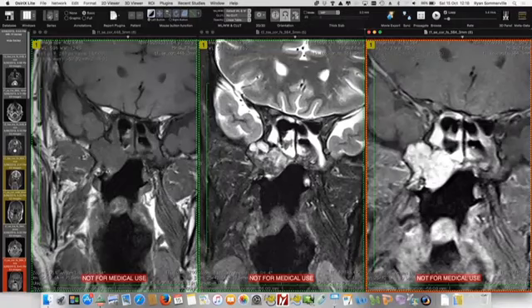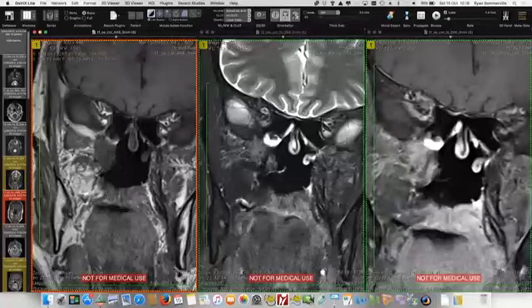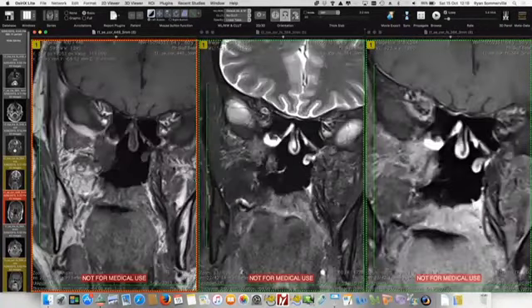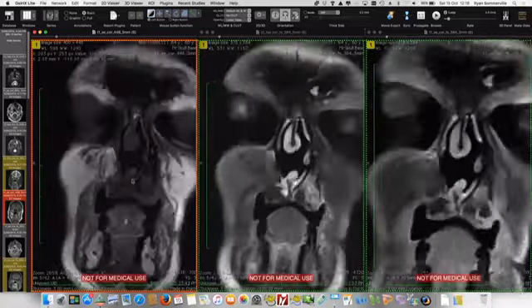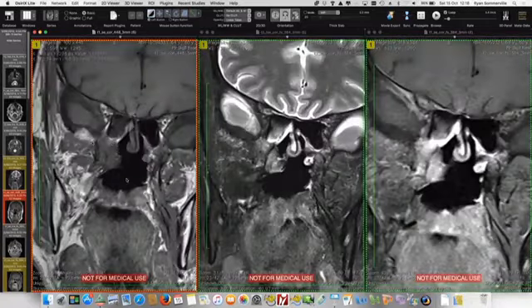So I just want to show you the previous surgery. You can see as we come forward, there's the denervation change of the pterygoids and the infratemporal fossa, and the flap coming through here. So you're going to expect, this is a very abnormal nasal cavity, which we'll see in a moment. He's got no septum left, he's got really nothing left there, and it's going to be scar as we approach the back end of that, and then immediately go back into where that tumour sits, coming off the front end of the sphenoid sinus into the pterygopalatine fossa.